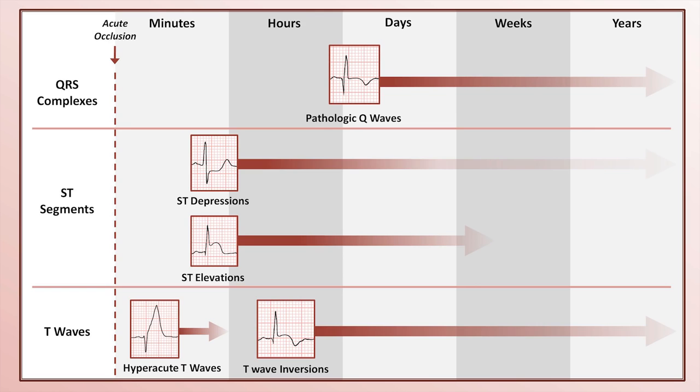However, once an infarct is more than several days old, that is, once ST elevations have resolved and biomarkers have returned to baseline, it is usually impossible to date an infarct from the EKG. In other words, an infarct that is 10 years old may look exactly the same way on EKG as it did when it was only a week old.